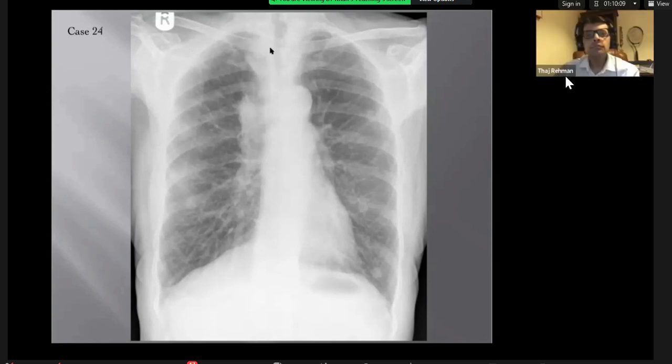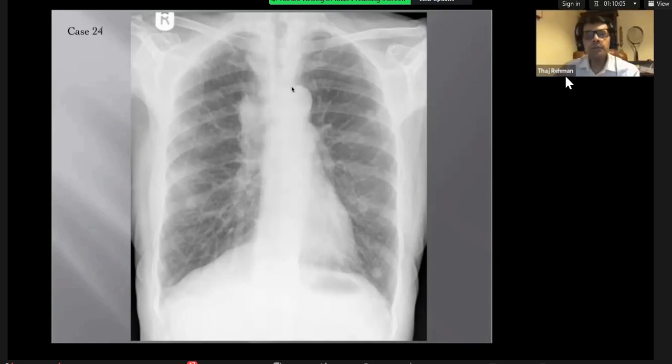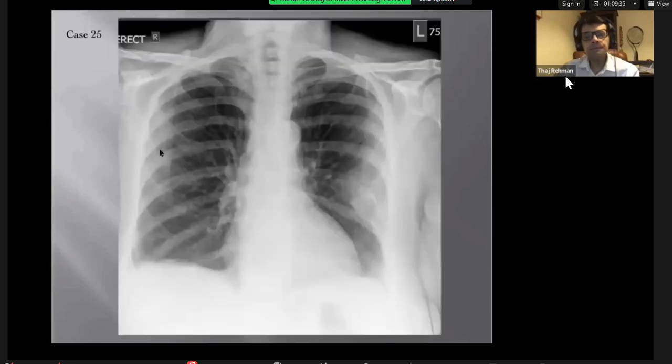There's also left. I'm running short of time, so I'm going to. Okay. The lung here, you can see is bordering the mediastinal borders, whereas here you can see an opacity. Good. So you should try to teach your eyes to pick up these abnormalities, and there is right hilar and tracheobronchial lymphadenopathy, and there is a nodule on the left side. So that's lung cancer that has metastasized to the mediastinum and hilum.